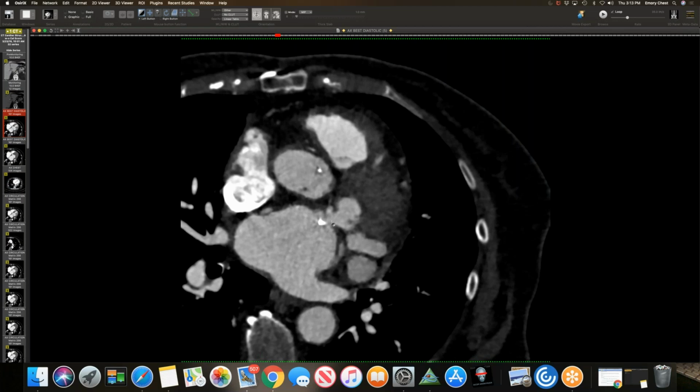So in this case, since it's in such close proximity to where the procedure was, I felt like it was most likely due to the fact that they dilated the valve, as I saw in the op report. So I felt like it was most likely an annular rupture resulting from the balloon dilatation that caused it.